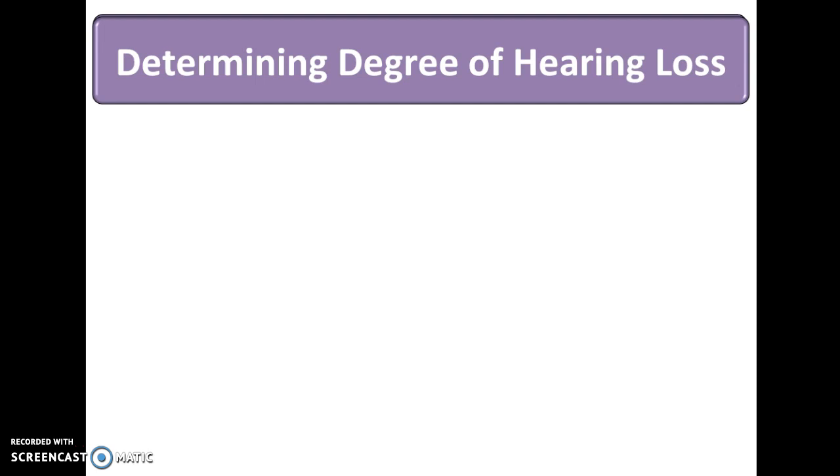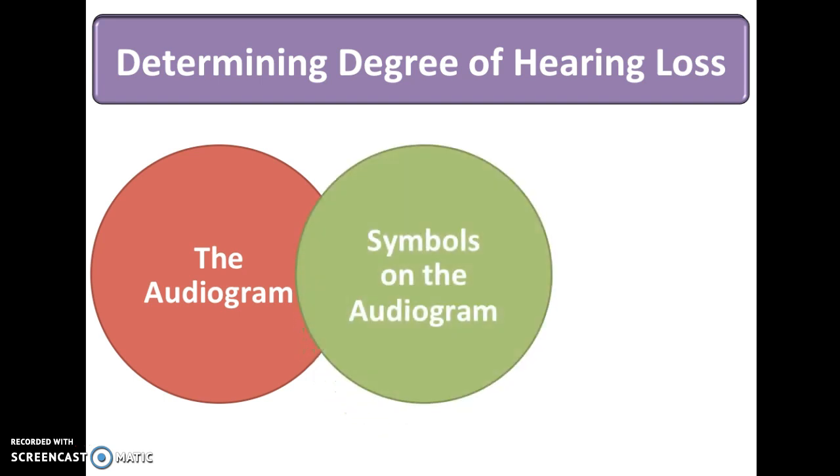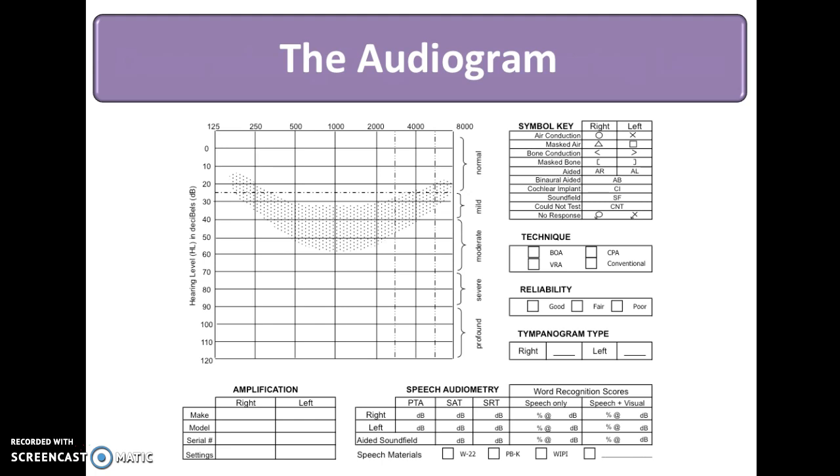Today, we're going to discuss how we can determine degree of hearing loss. In this presentation, we'll review the audiogram, we'll talk about the symbols on the audiogram, and we'll discuss the varying degrees of hearing loss. And here's our audiogram.